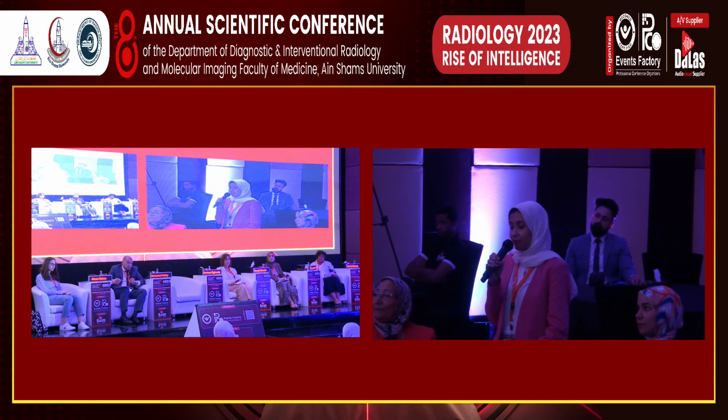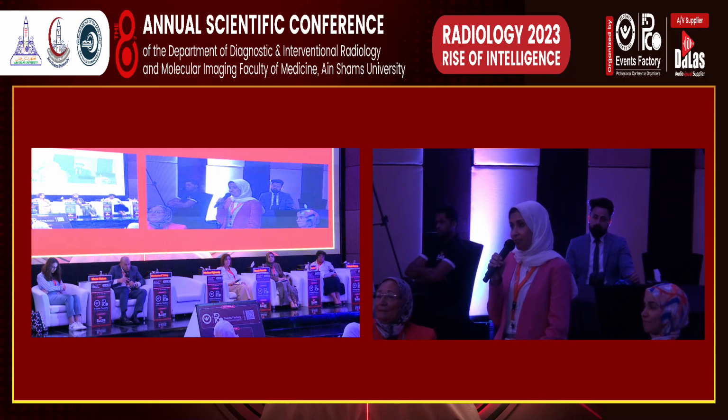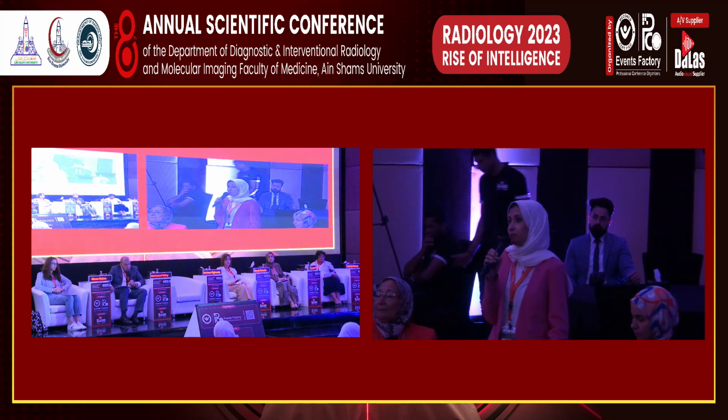ما هو هي نفس نقطة الحالة بقى الأخيرة دي بتاعتنا اللي هي الميتابوليك سيجنتشر. ما أنا مش شرط الحاجة اللي FDG avid هي دي الباثولوجي، أنا لازم أدور على الليجنز، يعني زي الليمف نود اللي في الحالة الأخيرة دي. الليمف نود دي ممكن تبقى ميست فيري ايزي لو ببص بس على الفيوزد ايمجز، لكن احنا شكلها باي سي تي فيها suspicious criteria، وبيكوز مش شرط لازم اشوف الميتاستاتيك ديبوزيت هتفولو الميتابوليك سيجنتشر.